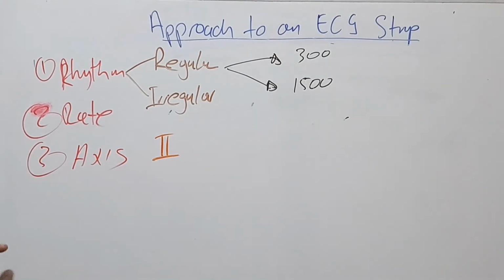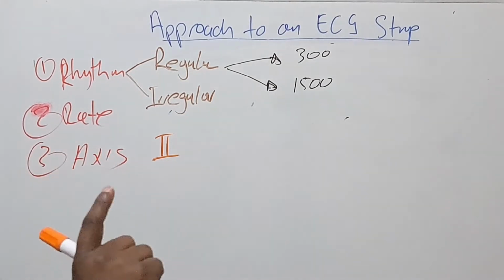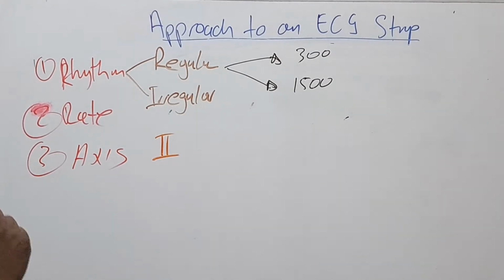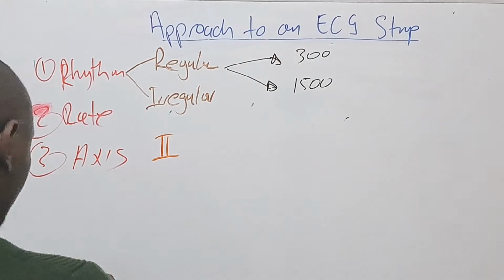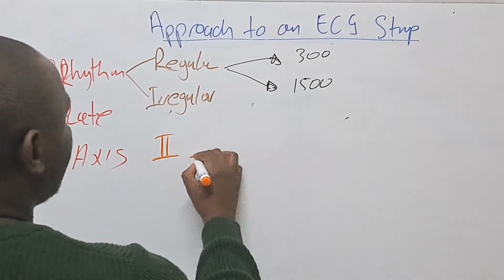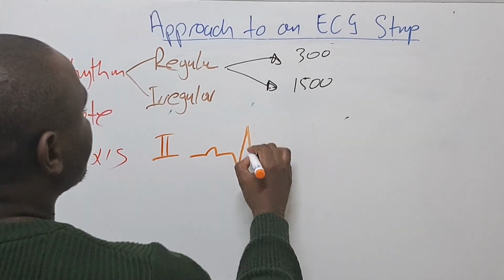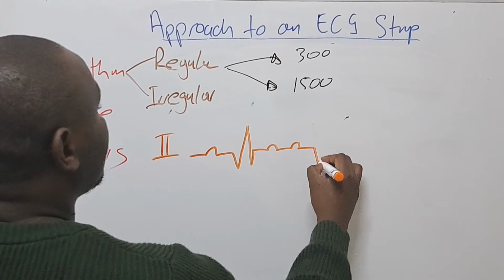There's a lead 2 that is about 3 seconds, just like the other leads, like V1, V2, V3, V4, V5. But the rhythm strip is the longest tracing, and it's usually lead 2. So you're going to find this lead 2 that is very long there. Nothing is drawn to scale here, guys.